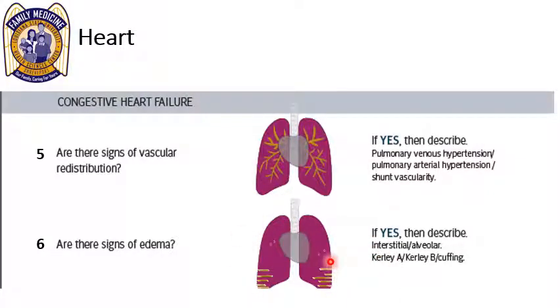But what you can see on the X-ray is what they call arborealization, which, arboreal, trees. If you see ferning and a tree-like distribution of the bronchial markings all the way out, and normally you'll be able to see some markings, but if you have engorged markings out to the pleural extremis here, then most likely you're going to have a full, hypervolemic patient that's going to require some diuresis.